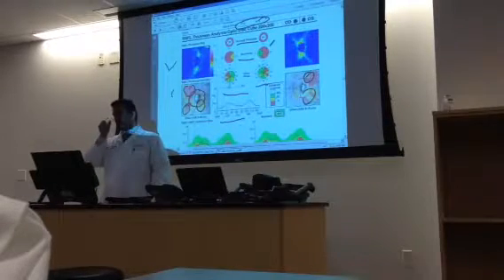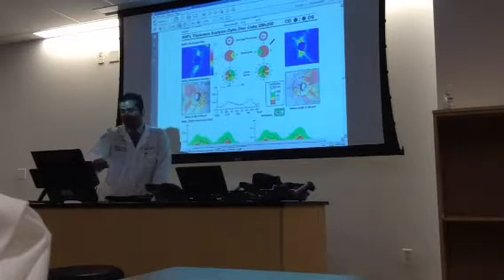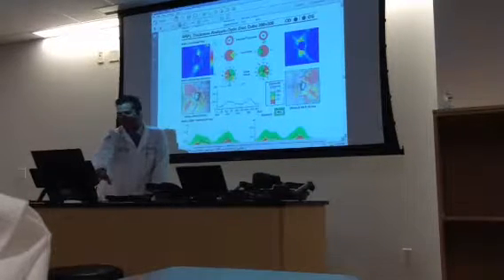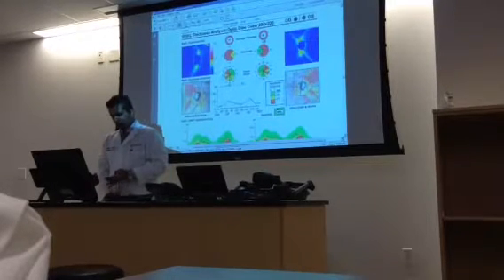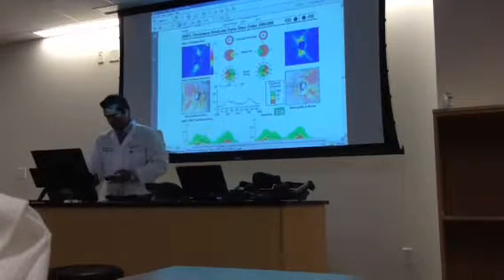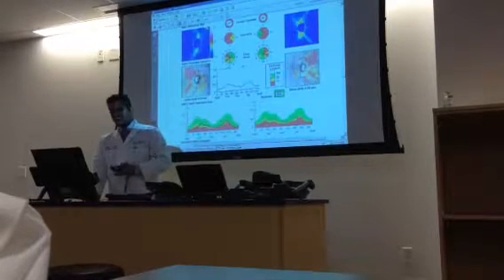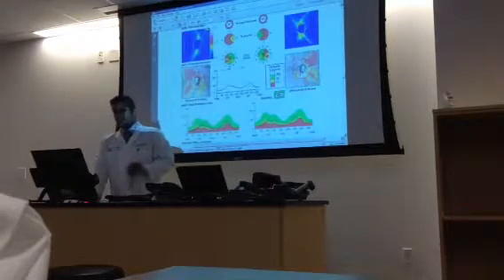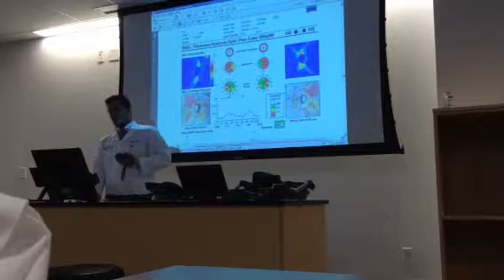Okay, so it certainly helps to obtain good data and cross-check with what your findings were. You see green, yellow, and red, and the nerve fiber layer is following. It's almost down to the red, essentially telling you that this is a very high chance of being abnormal. But of course, even inferior average thickness tells you that, the same story.